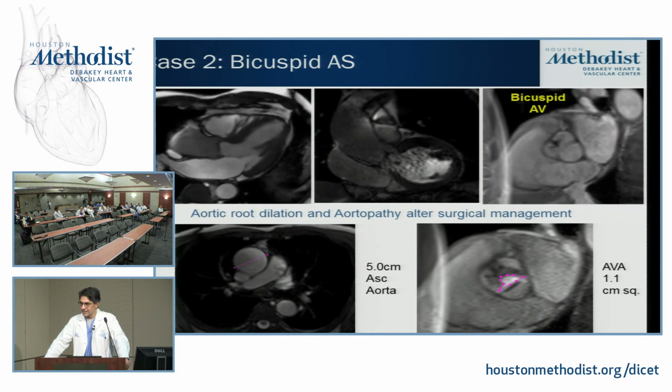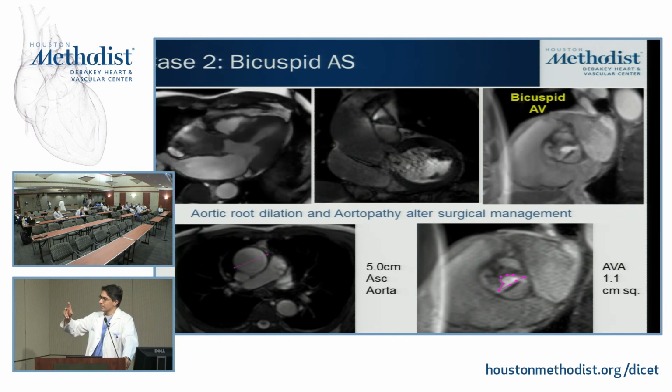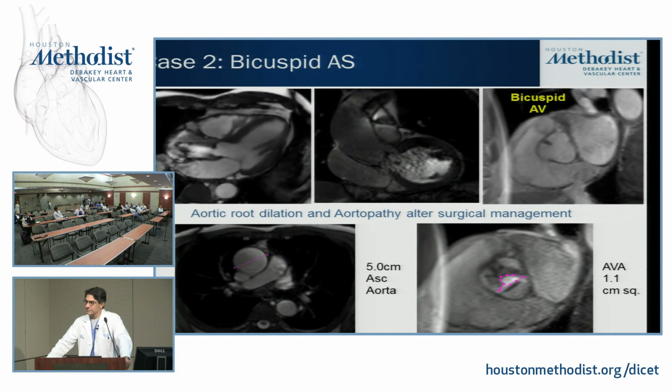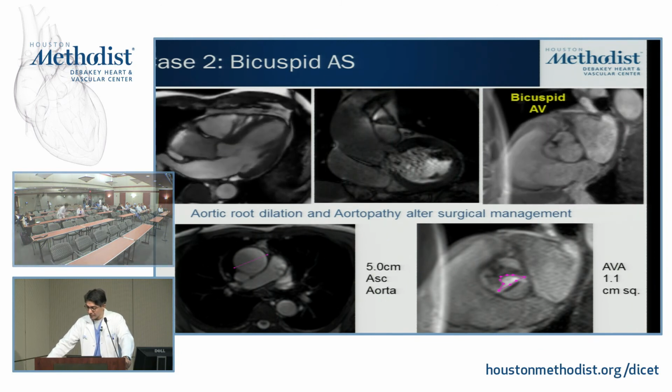So I have to look at flow because most likely in that first one when somebody has hemolysis and so many other things, your first thing is there's some paravalvular leak. And Dr. Q, Dr. Z, you probably agree that your valve area, even in that setting, will likely be underestimated. And probably the DVI is probably the best way to go about it, I would say. It's lower flow, so I have a lower gradient, but my valve area is still better. Agree, yeah, absolutely.